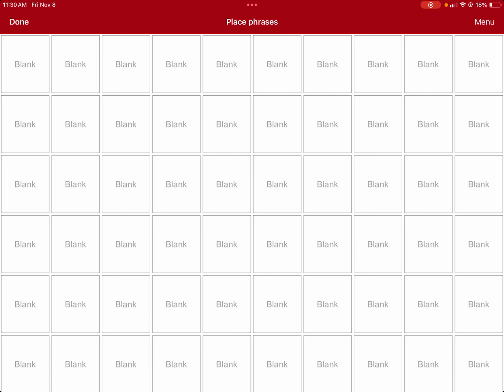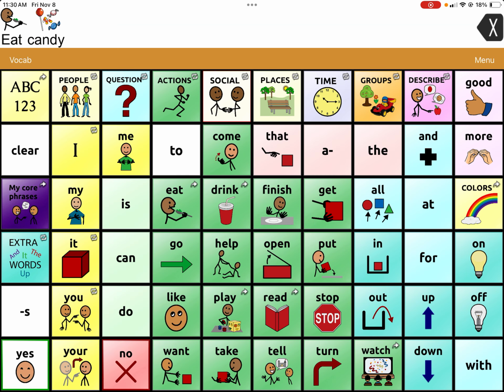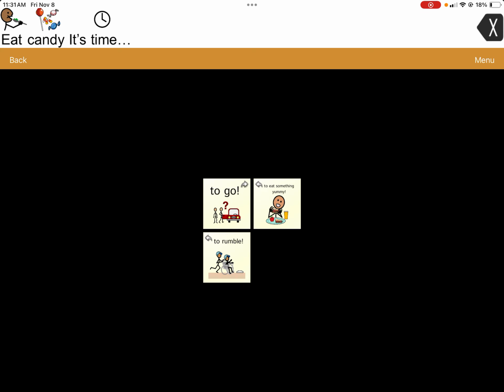I really like the it's time mix and match phrase. And so what I do is I have it navigate. It's time. And then I have different stage 2 gestalts that are kind of mix and match. To go. And that's my voice. Bed. It's time to go to bed. So that's a different way of doing it, and that's under the category of time, because it's time to do something. So you could have put that anywhere, but that's kind of where it made sense for me.